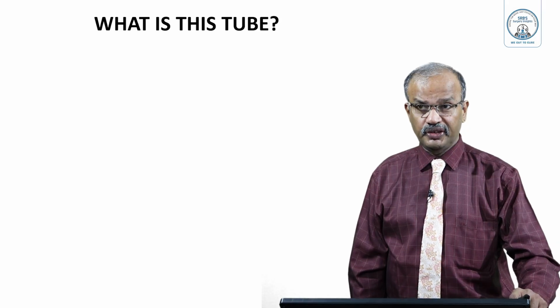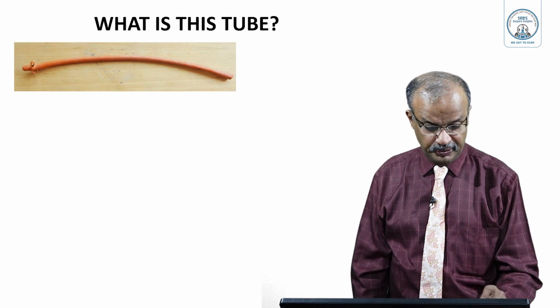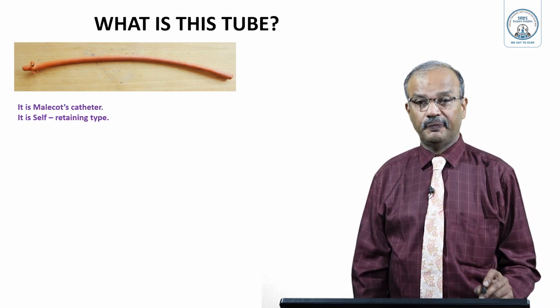Hello students, we will discuss a small tube instrument which is used commonly in surgical field. So identify it with a brief discussion. What is this tube? Look at that tube with the flower-like arrangement. This is Malecot's catheter.